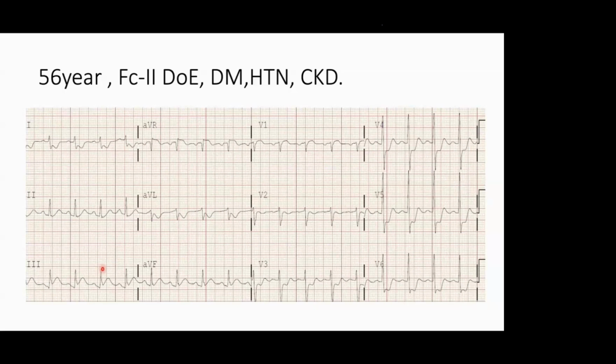Left main coronary divides into the left anterior descending and LCX. LCX goes to the back of the heart. So if that area is also ischemic, V1 elevation will be masked. That's why V1 is lower.